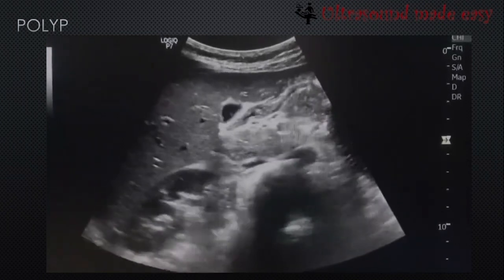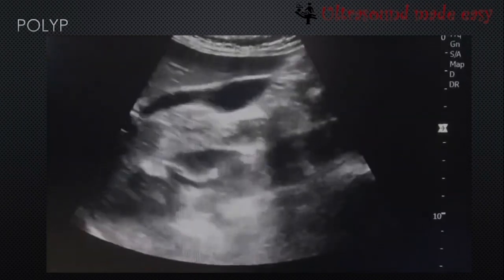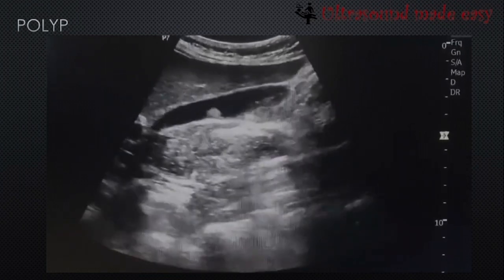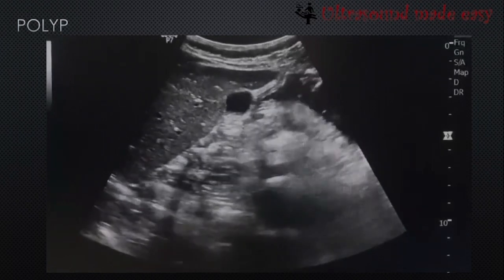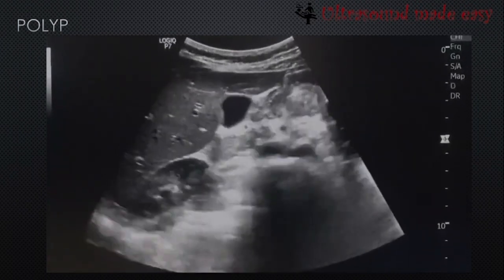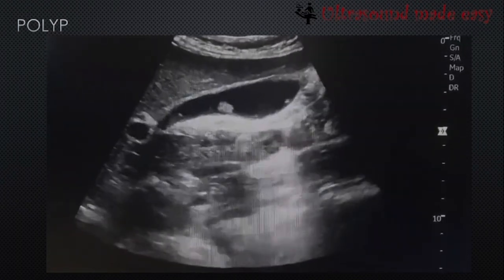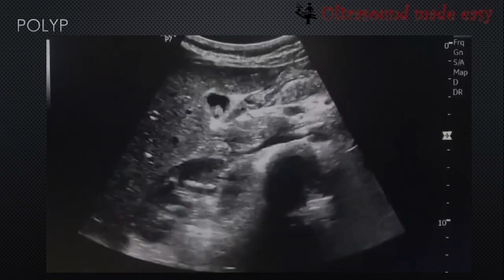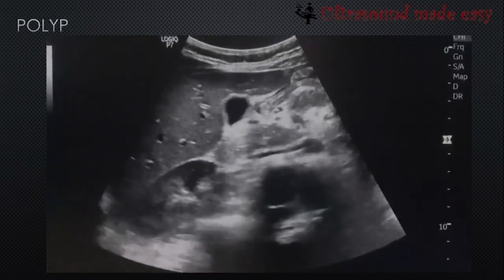So usually polyps are fixed without acoustic shadowing. If there is a posterior acoustic shadowing, it will be a calculus. If there is no posterior acoustic shadowing and the mass is not movable, the mass is sessile, so the possibility of polyp is more likely the diagnosis.